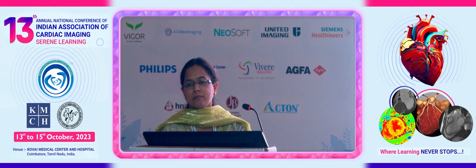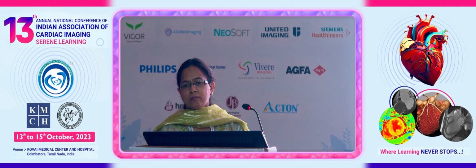One thing is, in India we also have EMF. For the residents to remember, a very close differential diagnosis of pure apical HCM, also keep EMF in mind. If you have rounded apices, more frequently seen on the right side and sometimes in 1/3 of patients bilaterally, then EMF also should be kept in mind. The only difference would be that it will not open up in the diastolic phase.